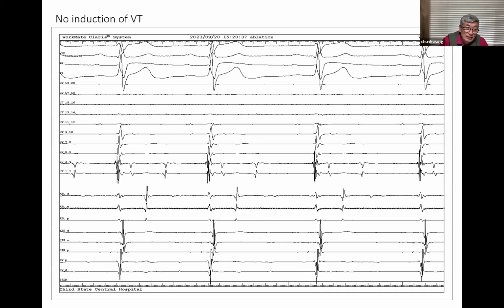Look at there, there's a nice example. Look at the LV signal 3-4. Is it that sharp, small fascicular potential? No. That should look like that. Look at and compare the size, the amplitude, the duration of your signal. How can an electrical fascicular potential last that long? This is almost like 100 millisecond duration. It doesn't make any sense.